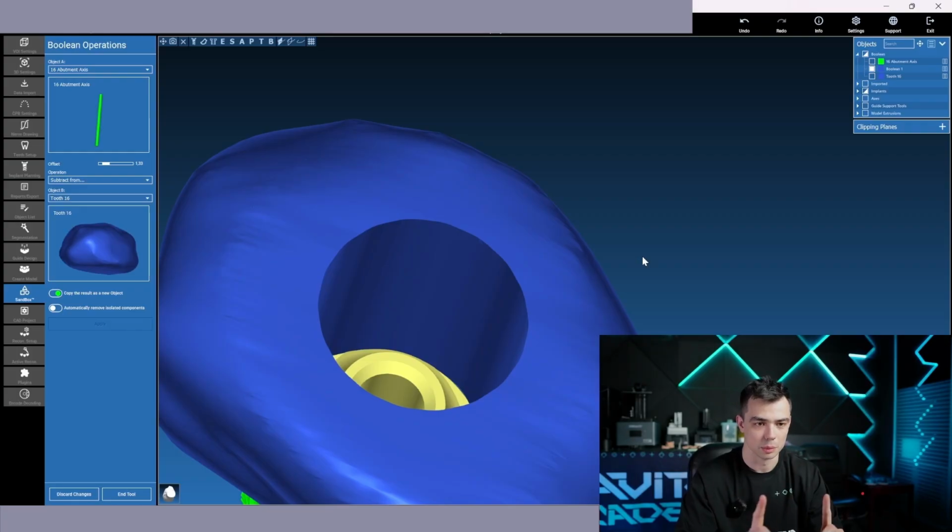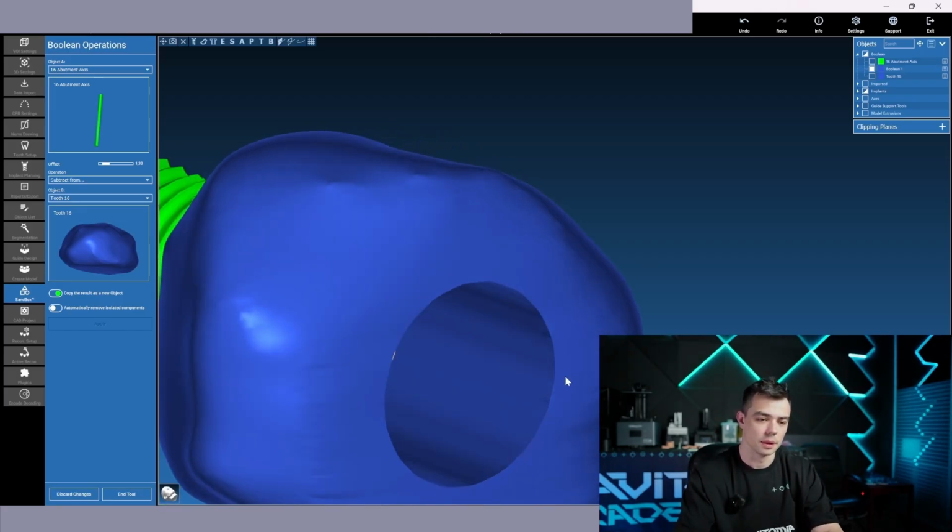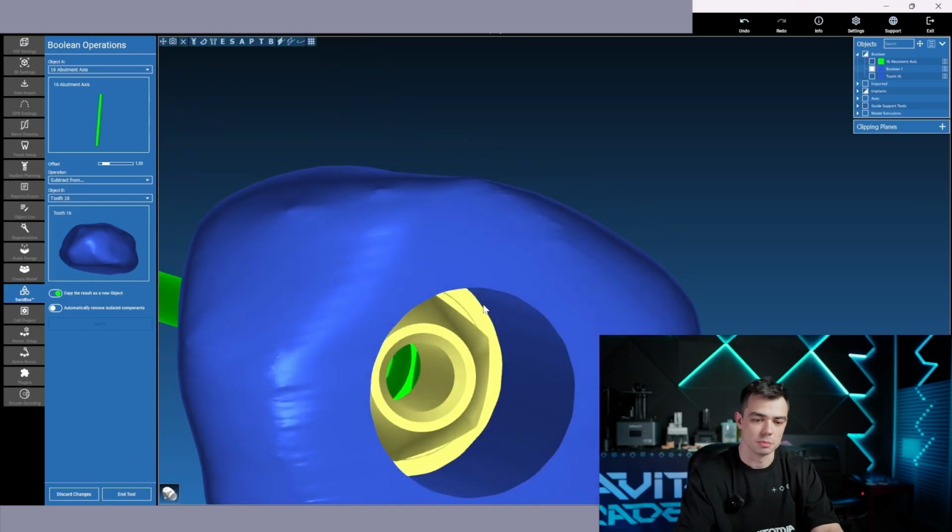So please scratch it somehow, and this surface has to be rough.